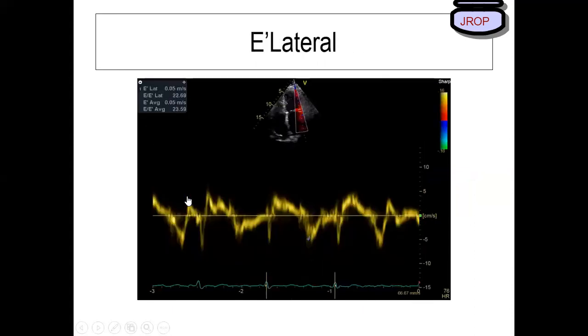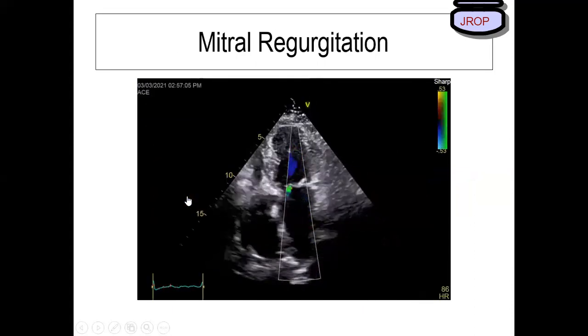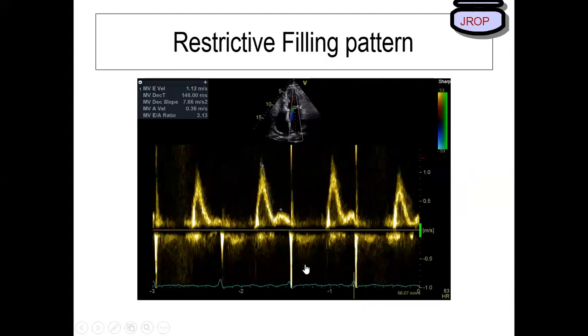And most important thing is, when we go and look at their mitral flow patterns, look, this patient is intermittently in atrial fibrillation. In this now it's NSR. Tall E, small A. Yes, sir. And E/A ratio is more than 2:1. Deceleration time is 146. Anything less than 155 is considered a restrictive filling pattern.